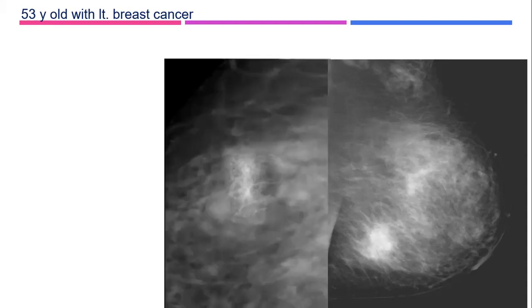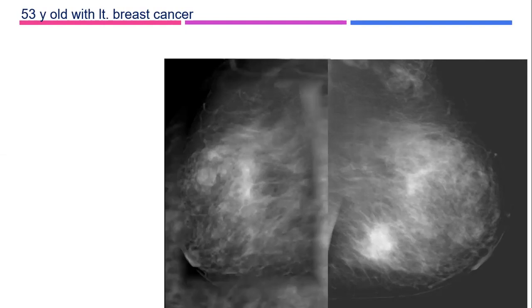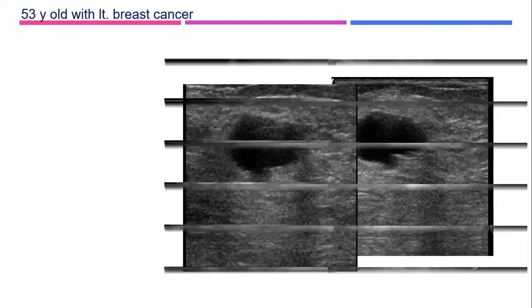You see, that is why I missed these findings. Okay, and this is a zoom, even this is not a spot magnification. With this zoom, you can see the indistinct margin. It was good to pick up this area, but an indistinct margin with a cyst can be just an inflammatory cyst. And even this small distortion can be just an inflammatory cyst. I was thinking in that way and I ignored, or I did not characterize, this axillary lymph node. And it was bilateral cancer.